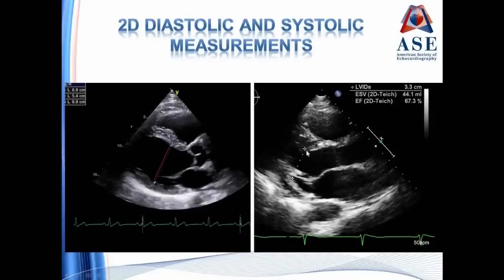Here is the systolic measurement in a different patient, and again, the frame is picked by the smallest LV dimension rather than any EKG timing down here.